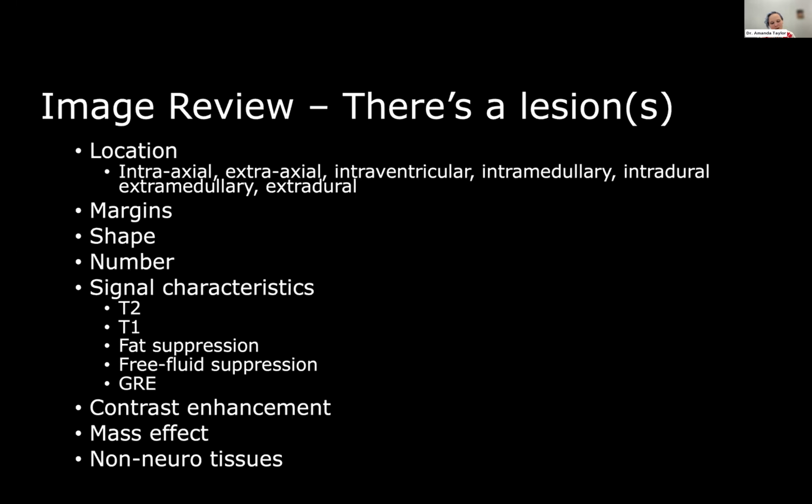is look outside the spinal cord, outside the brain, outside the vertebra, the skull, to find other things which are probably important, even though they're not quite as fun to look at as some of the nervous system structures. Yeah, the extraneural structures are our least favorite, I suppose.